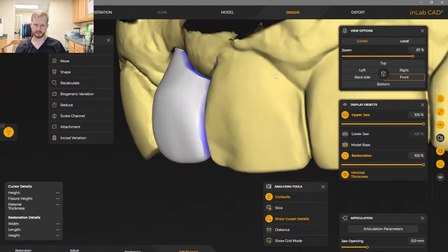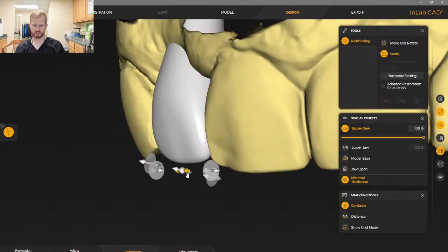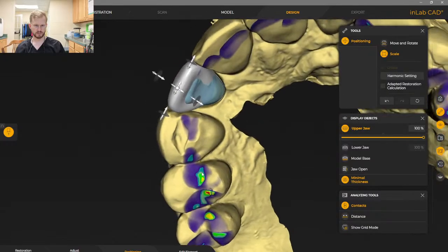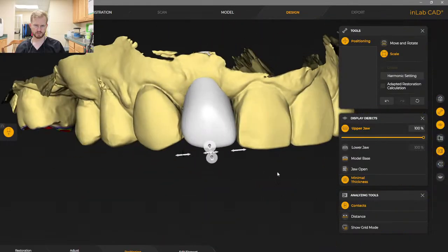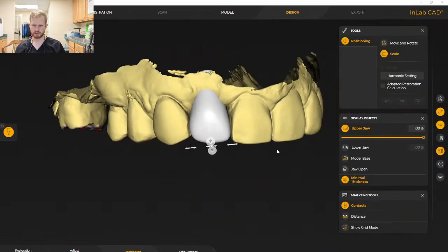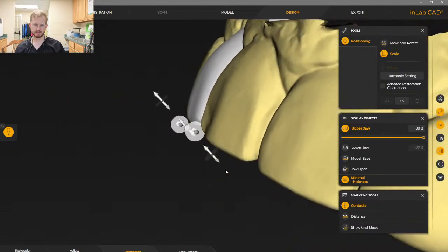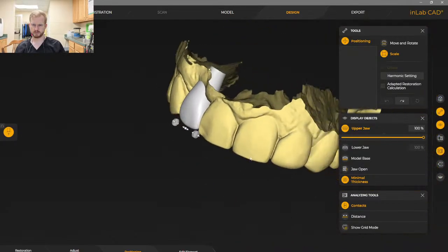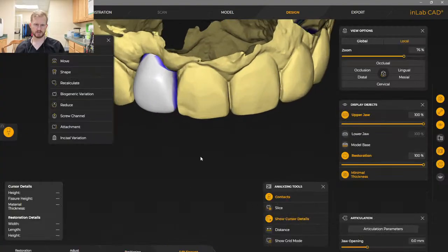All right, well, let's come in here. Let's play around with positioning a little bit more. Set that. So I like my incisal edge position. We really just want to tuck in that cervical portion. We'll do that shortly. Let's go back to our element here.